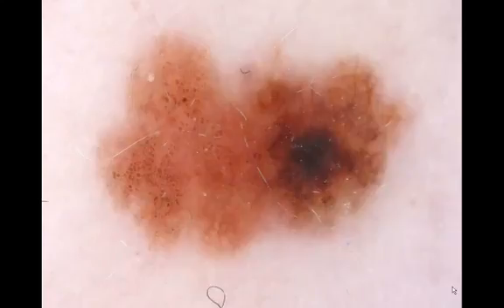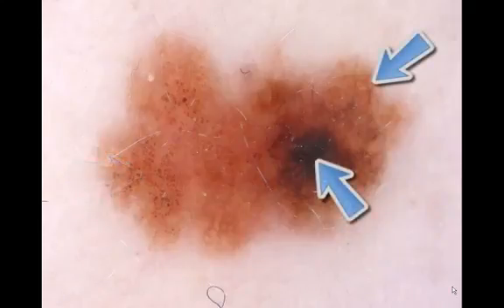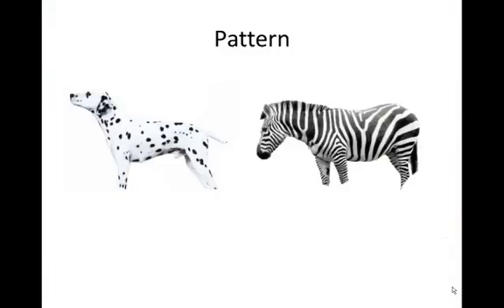We can see multiple patterns. We can see globules or clots, we can see lines, and we can see a structureless pattern. And all we need to do is to describe these patterns and then to make a diagnosis. Well, we are really good at describing patterns.